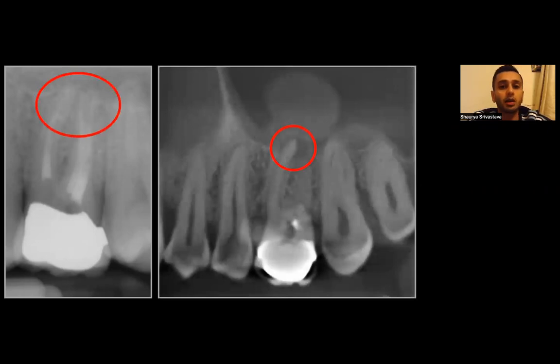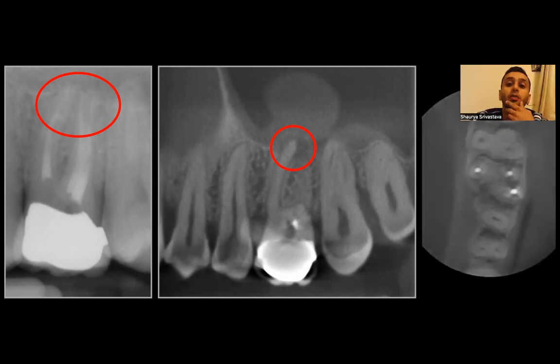So again, you're thinking, right? Initially, before you refer for a scan, you're wondering why it's failed. It's talking like a duck, walking like a duck, but you cannot see the duck. And this is where you will see the duck, in the CBCT scan. When you look at a different plane, as you can see, it's a cheeky MB2. That's the culprit, because there's no other reason why it should have failed.